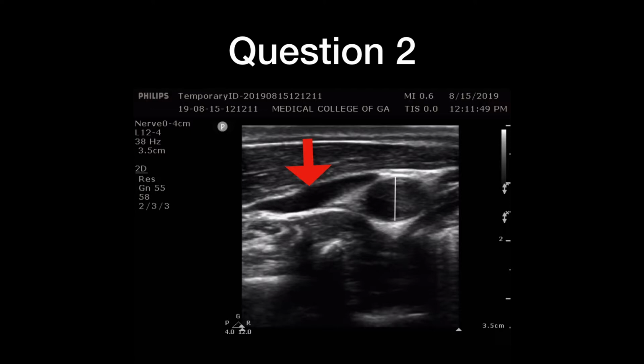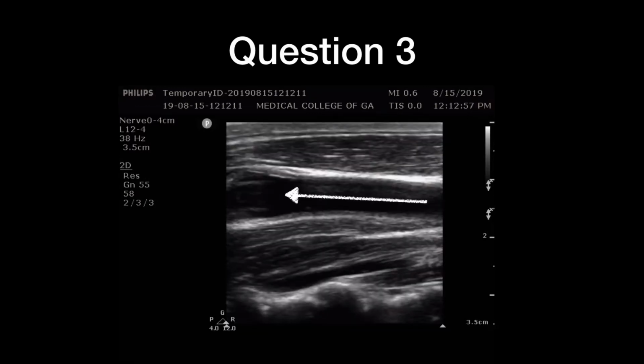Because the jugular vein is gravity dependent, when someone stands up, almost always that jugular vein will be collapsed in a healthy person. The carotid artery should not change significantly in diameter based on position, because the carotid artery is under quite a bit higher pressure. So the arrow should have been on top of the jugular vein, as you see in this image here.